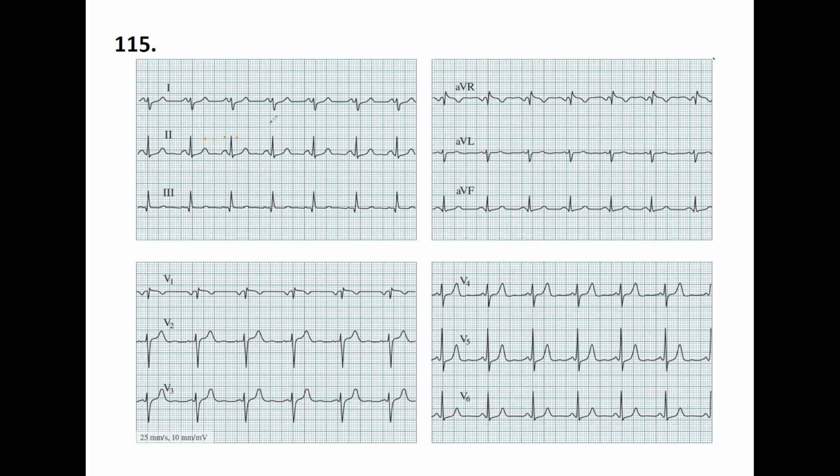And for the axis, lead 1 is positive. Lead 1? It's not positive? No, it's negative. I thought that the upside part maybe is longer. No. During the ventricular activation, you want to see how much time the axis is spent toward the electrode or away from the electrode, and you have to summarize it.